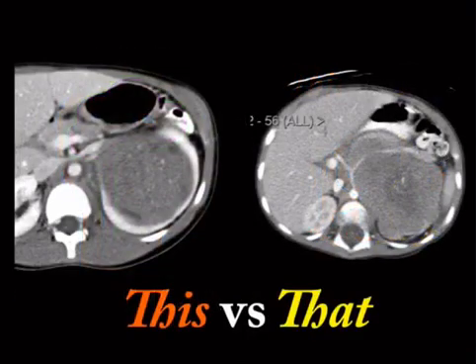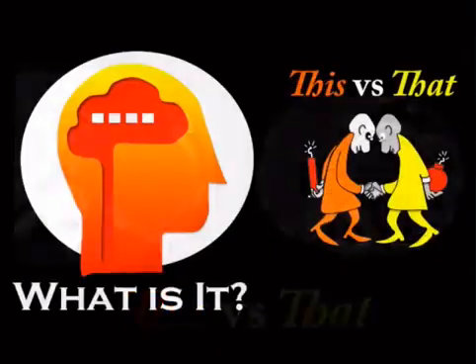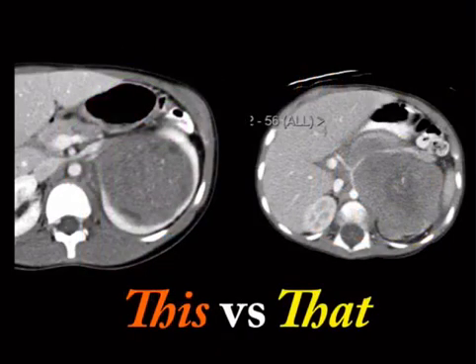So, moving on, comparative case here. Now we move into a solid organ. Both of these things are in the general vicinity of the kidney. One of them has a claw sign, so this is clearly coming out of the kidney. Be a little bit easier if it was shown on a coronal view, but don't expect everything to be easy. And then this one here, not necessarily seeing a kidney, as for the purpose of gamesmanship.